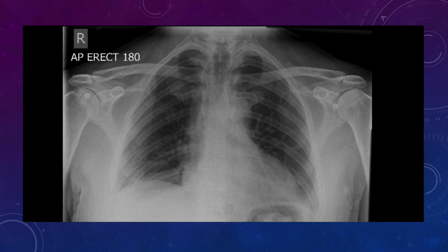There is a phrase with chest, no acute displaced rib fracture, i.e. there can be undisplaced fractures that I just can't see on a plain film. We're going to have to CT them to be sure. Okay, so no acute displaced rib fracture. And then we need to rule out a pneumothorax. With that amount of rib fractures, we need to be thinking pneumothorax. We need to be thinking about anything along those lines. So it's just assessing it.